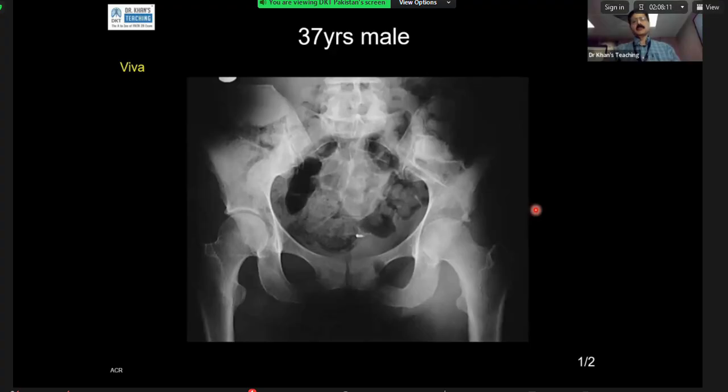In an adult, you can do ultrasound, but better is what? An MRI? Yeah. In children, the point is to do ultrasound, confirm it and aggressively treat it. This is quite a full-blown case.